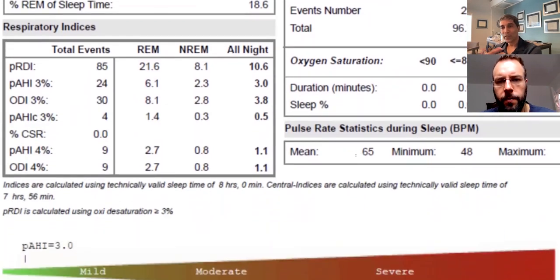I don't like that. I mean, I know 50 to 70 is normal, but there's a study that shows that for every 1% higher average heart rate you have at night, it equates to a 3% greater sense of anxiety or stress during the day. Interesting. So the lower your mean heart rate is at night, the better. Very interesting. I did not know that. And so I look at that and I say, that's a little high. So start working out. Aerobic is the best because that'll really get it in shape. But weights are important too.